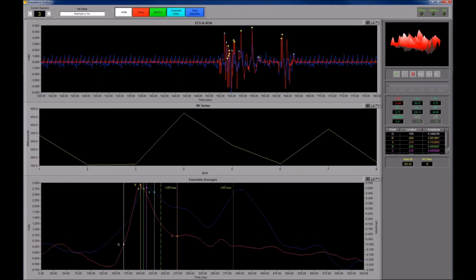And so this is another example that this sort of editing that I'm about to show you could come in handy whether you're doing impedance or HRV. And that is making some tweaks to the peak detection settings so that we can deal with the fact that there's this large noise, or relatively large noise compared to the actual peak of the R peaks, and still mark the majority of them and limit how much editing we end up having to do.